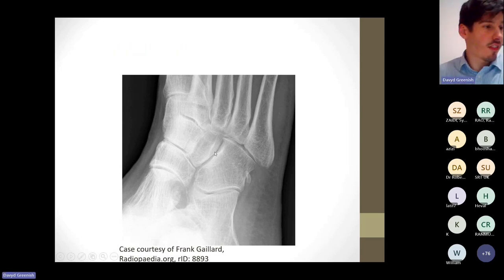Okay, just a couple very quick ones to finish off. Everyone hates an ossicle in the foot, so let's just go through a few of the quick normal variants in the foot, and then you're all done. If a question like this would say, what is the normal variant displayed on the radiograph? And these are tricky.